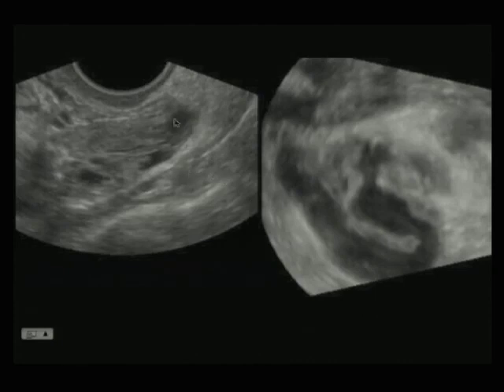Well, let's go back to what we were seeing before and see if we can figure out what we were seeing. Well, we were seeing a dilated tube. This is a part of it there. There's another part of it here. There's another part of it there. This tube is going in and out of plane here. And unless you can actually generate the image that goes in and out of plane, which we have done over on the other side, you can't really appreciate that this is a hydrosalpinx. And in fact, there is the ovary, which is right next to the hydrosalpinx, which looks normal. So 3D ultrasound can actually help you to learn what you're looking at in 2D.